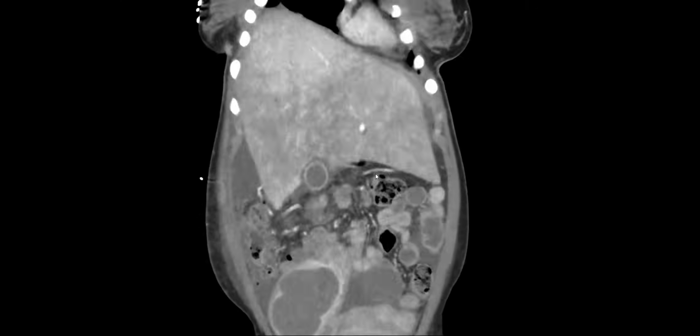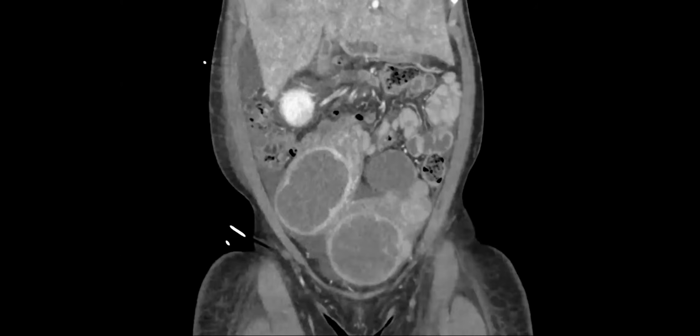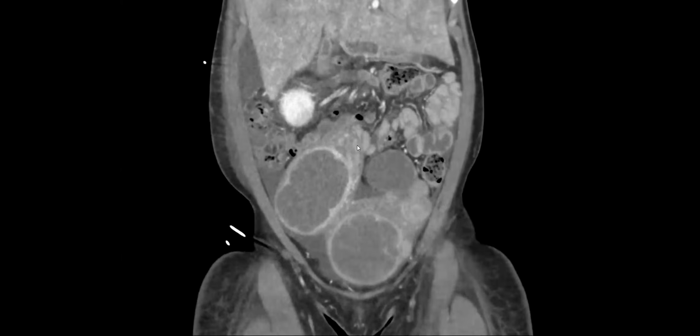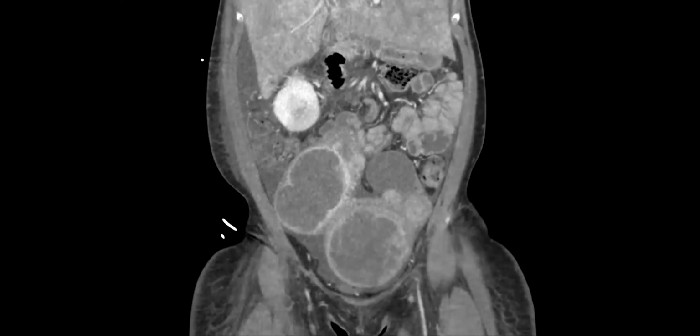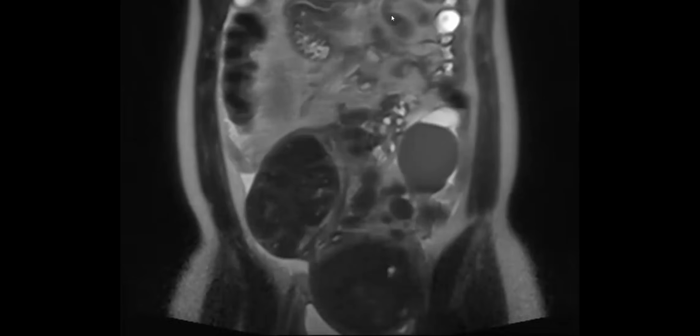Another interesting part of this case. Are those all just ovarian metastases bilaterally? No, that's what I wanted to show you. These are actually necrotic fibroids, but the cool thing is it's a bicornuate uterus. I'll show you the MR where you can see the two endometrial cavities separately. So we incidentally had a uterine anomaly. And Nelly, back to your kidney observation, yes, the left kidney was absent because of this uterine anomaly.